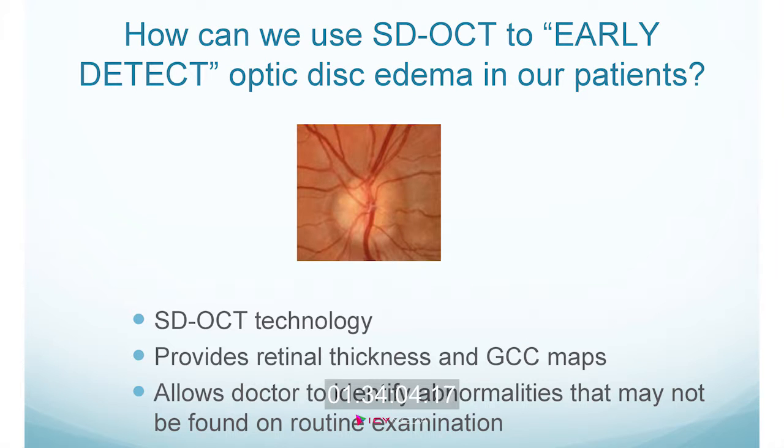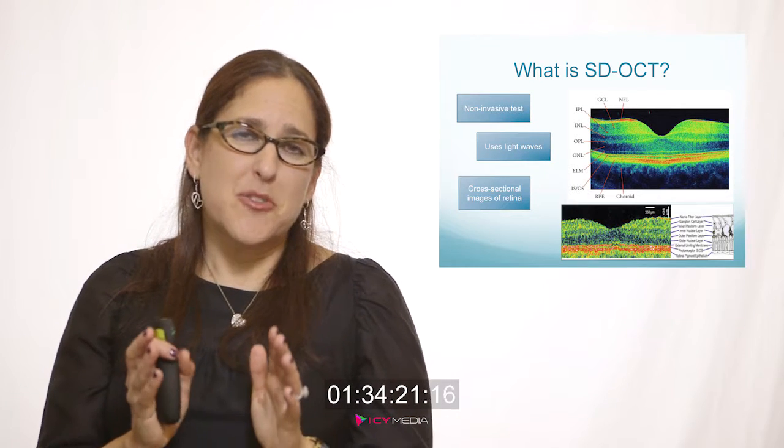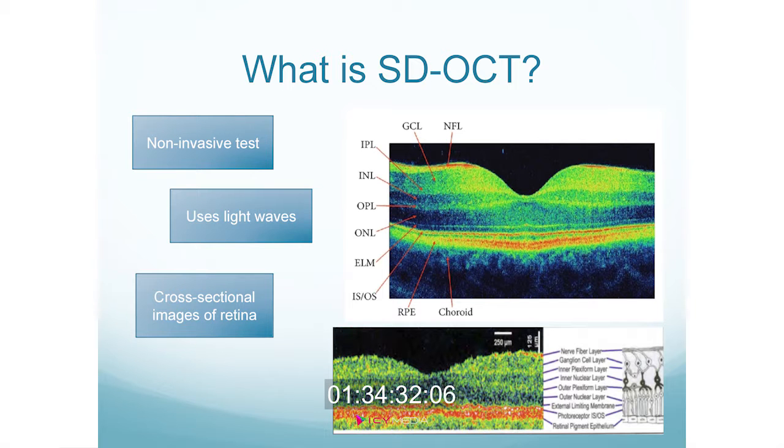We're going to look at retinal thickness maps on these patients. We're going to look at ganglion cell information on these patients. And we're going to put together a whole picture on the patient before we even see them using some preemptive screenings from the OCT. So I put this picture into each of the webinars because, again, I have to emphasize the importance of understanding the structure of the retina and what it looks like on OCT so that you can discern what normal versus abnormal look like, okay?